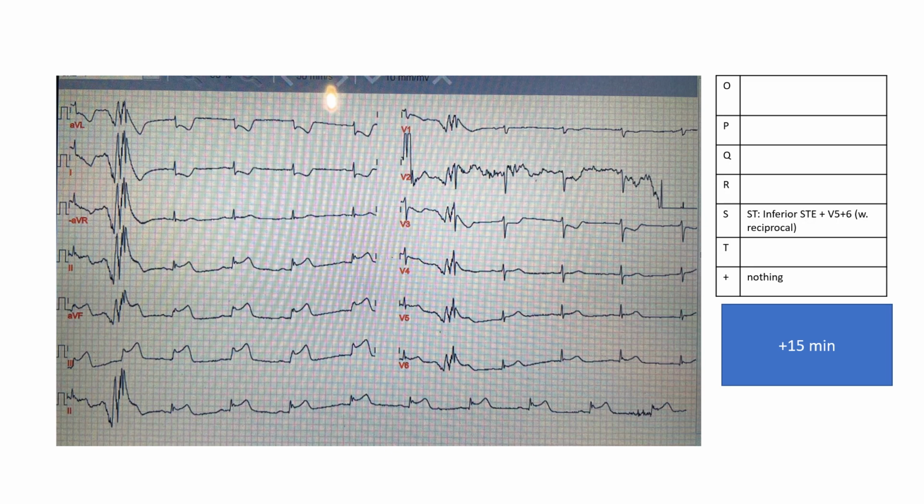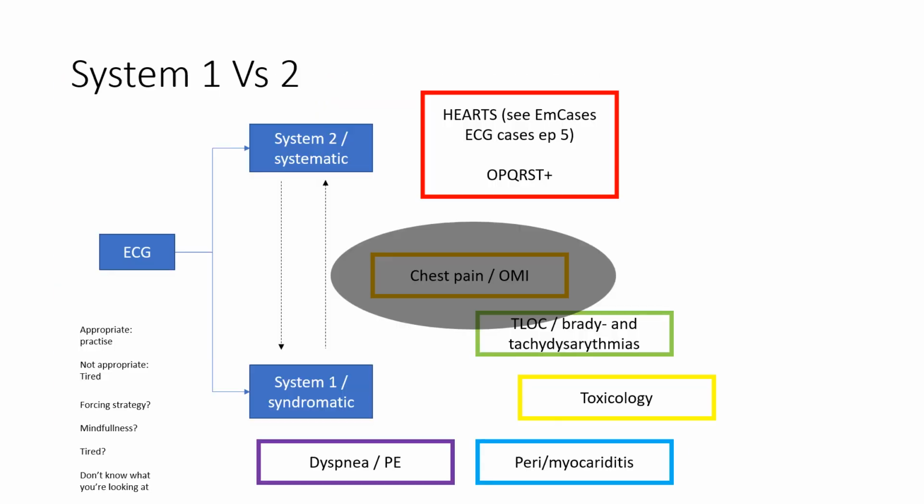And when they did this PCI, it turned out to be a proximal RCA. That's why we're seeing so many other changes than just the specifics here. And these patients, just to remind you, in the literature we usually say that they should not get nitro because they're preload dependent, and if you give them nitro, they'll tank their blood pressure and become shocked. Okay.